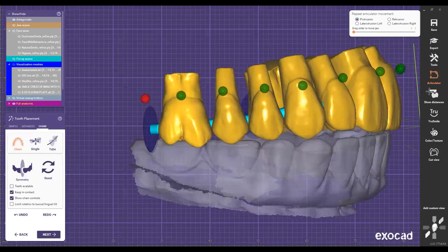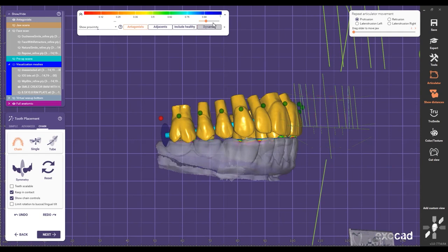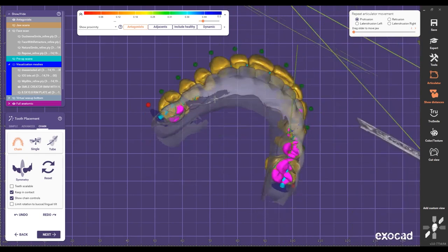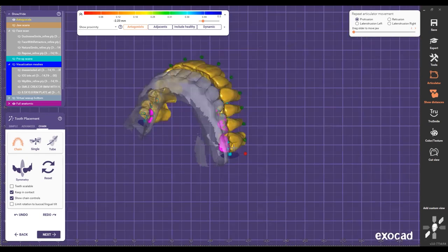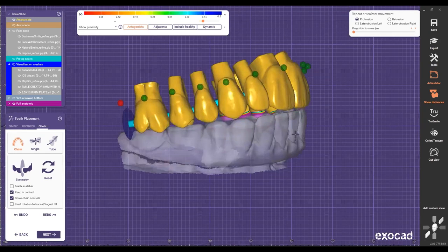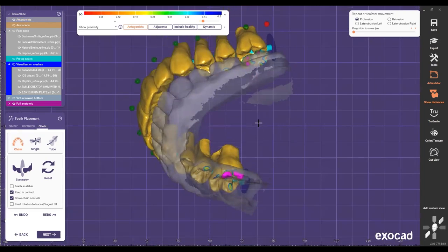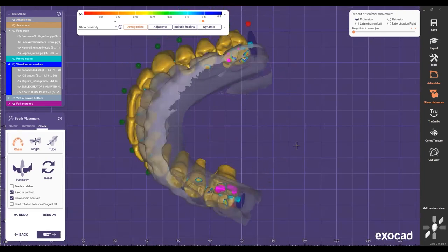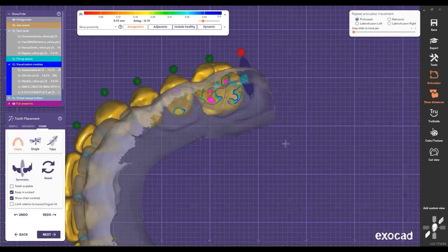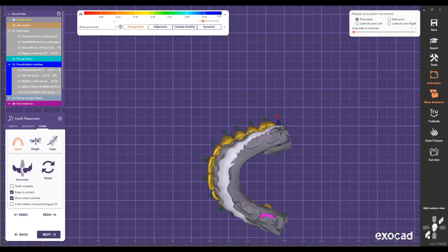So I'm gonna start showing distances. I'm gonna go to proximity, turn off dynamic for now, and I'm gonna put 0.5, because I want my contact to be in 0. So I can visualize this right away. Okay, so I can see my teeth right there. I'm gonna leave it there, and I'm just gonna start lifting it here, and I try to put in that ideal occlusion right there first, and then later I can say, okay, now I have it properly there, and now I can go to this one.